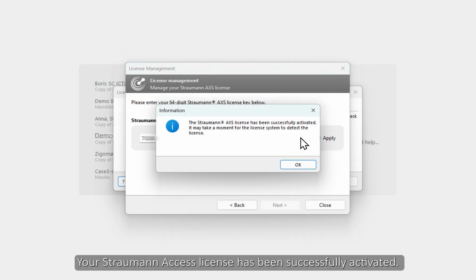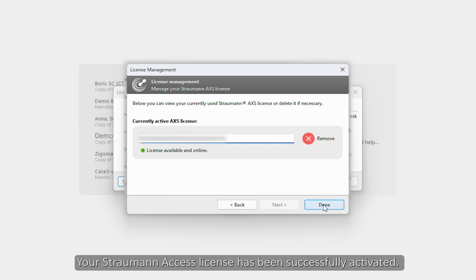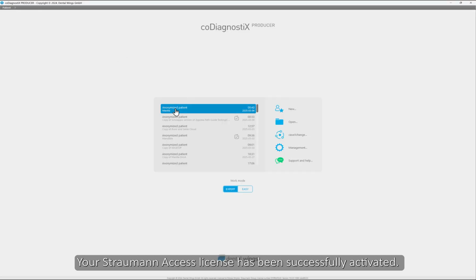Click Apply. Your Straumann AXS license has been successfully activated.